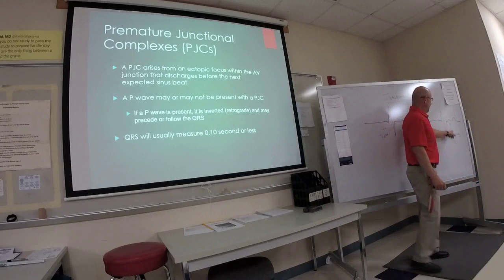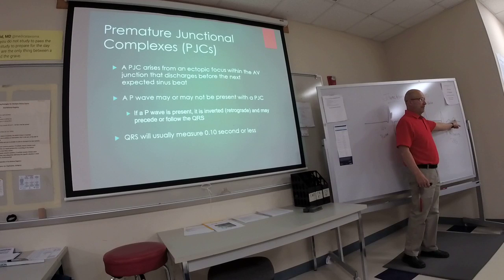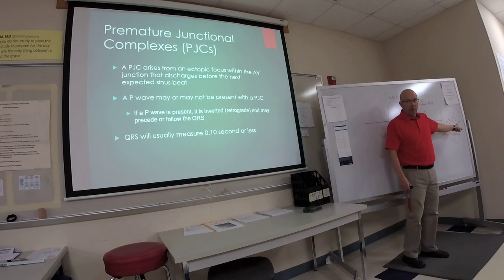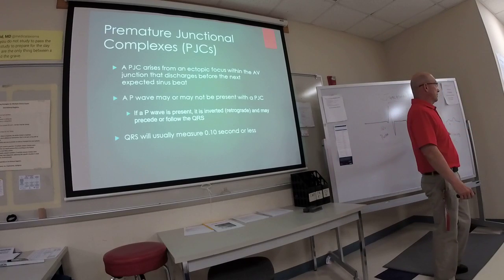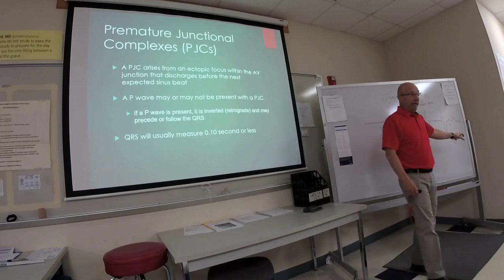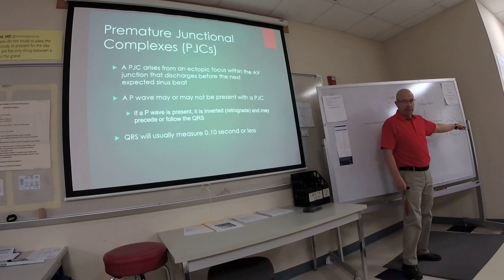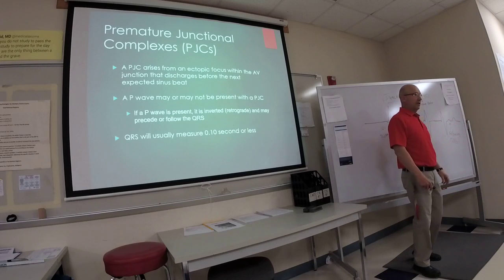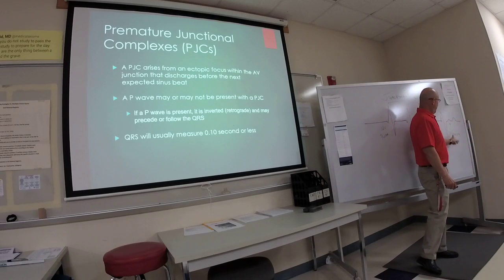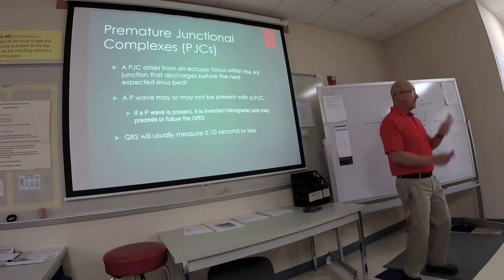What you have to keep in mind if you have this scenario where it follows the QRS complex is not to try to make this a P wave. That'll make a lot more sense when we talk about heart blocks, because the problem with the heart block is you have more P waves than QRS complexes. So more P's than Q's. Don't try to make that T wave into a P wave. Know the difference in the way that they look. The P wave follows because it's just a delay in conduction. So it's going to follow this QRS complex.